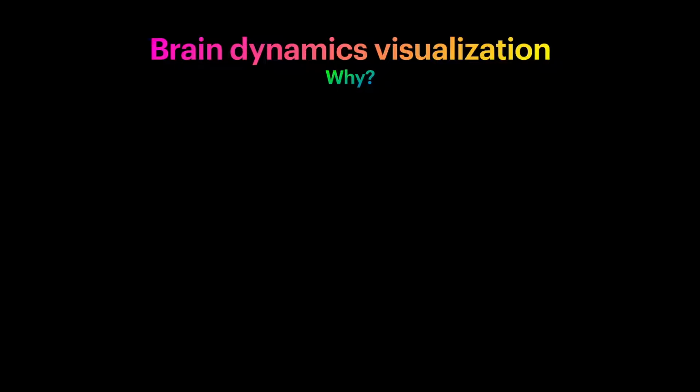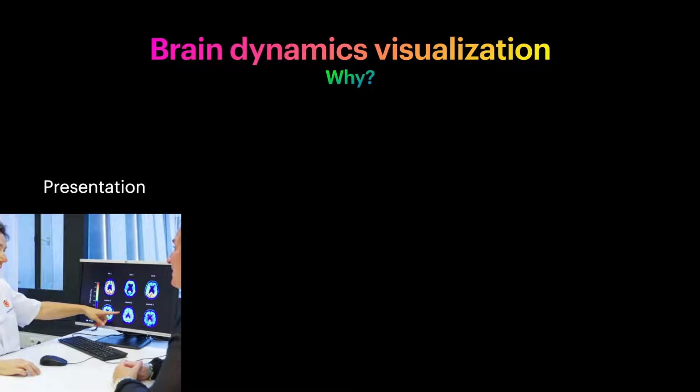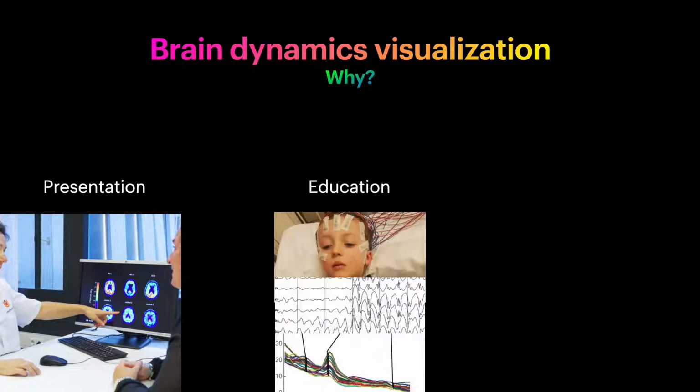Yeah, but would that still be useful? I hear the scientist in you ask. Definitely. We often want to present data to colleagues, students or patients, so making it more intuitive than just a bunch of lines will already help tremendously. But then, for persons trying to learn visual EEG evaluation, it will also help when there is a more anatomical readout instead of just the raw signal.